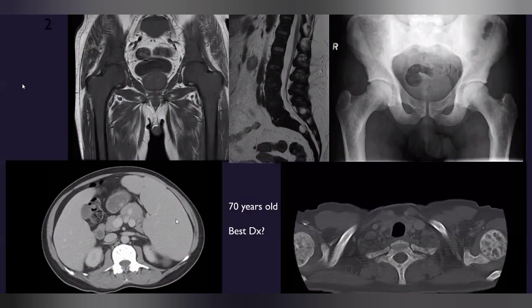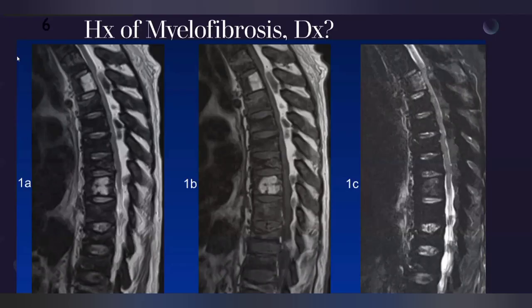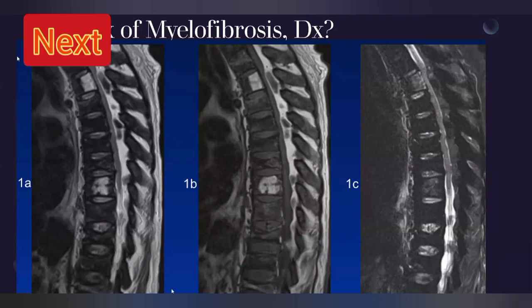Basically, in other hemolytic anemias like sickle cell disease, the spleen is shrunk, but here the spleen is enlarged, and this is all a marrow infiltrative disorder with avascular necrosis and splenomegaly, the same case with myelofibrosis. But these are actually extramedullary hematopoiesis in the epidural fat. Epidural fat does have stem cell remnants, and not only the paravertebral masses, but epidural masses can become a source of extramedullary hematopoiesis. Lipomatosis is one of the differentials, but where there can be a cause like myelofibrosis or sickle cell, you can have epidural extramedullary hematopoiesis as well.